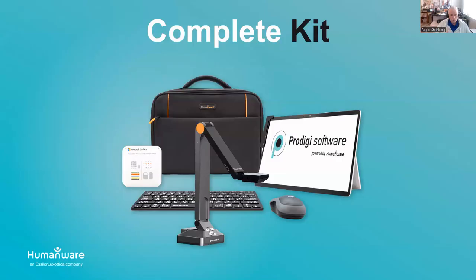We do have two additional options left to go over. One is a complete kit, and in this setting, you would get all of the components of that starter kit. So you see there in the foreground, again, the document camera, to the left, the adaptive kit, and then the back of the image, you see that carry bag. But we add at least four other items here that come to mind in the image here. And probably most importantly, to the right there, you see a Microsoft Surface tablet. That's a Surface Pro tablet.